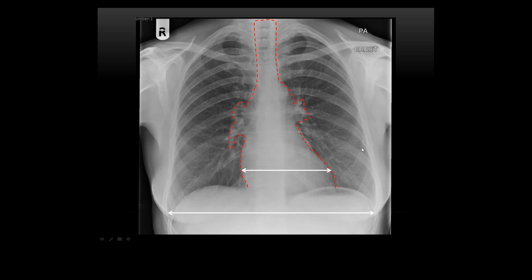So if there's nothing to attenuate the X-rays, they go straight through the patient and hit the detector. But when you put fluid around another structure, or you put cancer around the hilum, that mass or fluid is going to absorb more X-rays, so it becomes whiter on the chest X-ray. So use it loosely, because exposure also matters. If you don't give enough X-rays, it's also going to look a bit whiter. But it is a good tip. If you see a globular shaped heart and it's a bit denser, then you've got to be suspecting that they have got a pericardial effusion.